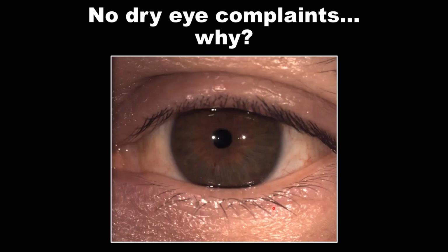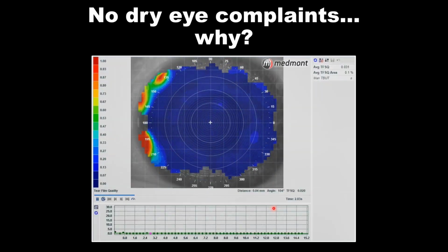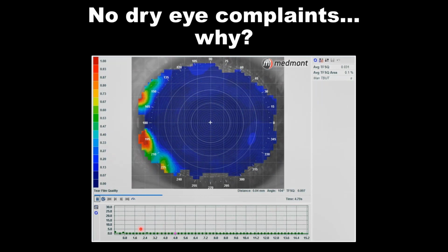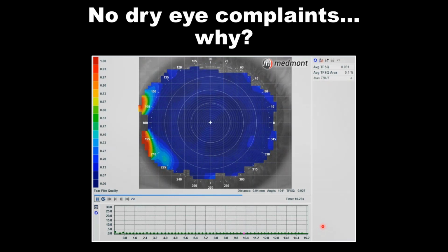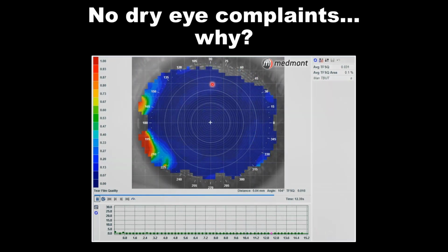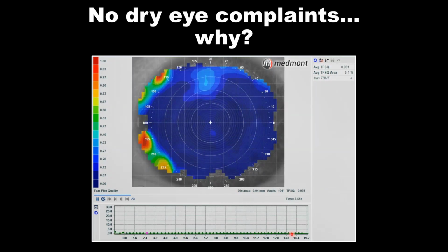So why is this patient doing so well in soft lenses? For a 55-year-old patient, you wouldn't expect them to be able to go from AM to PM. He told me that he wears his lenses about 18 hours a day sometimes and completely without issues. When we did a dry eye test on this patient, you notice a complete flat line of the tear film. In other words, the tear film surface quality test is looking at the ring reflection over a span of time, in this case, about 15 seconds.